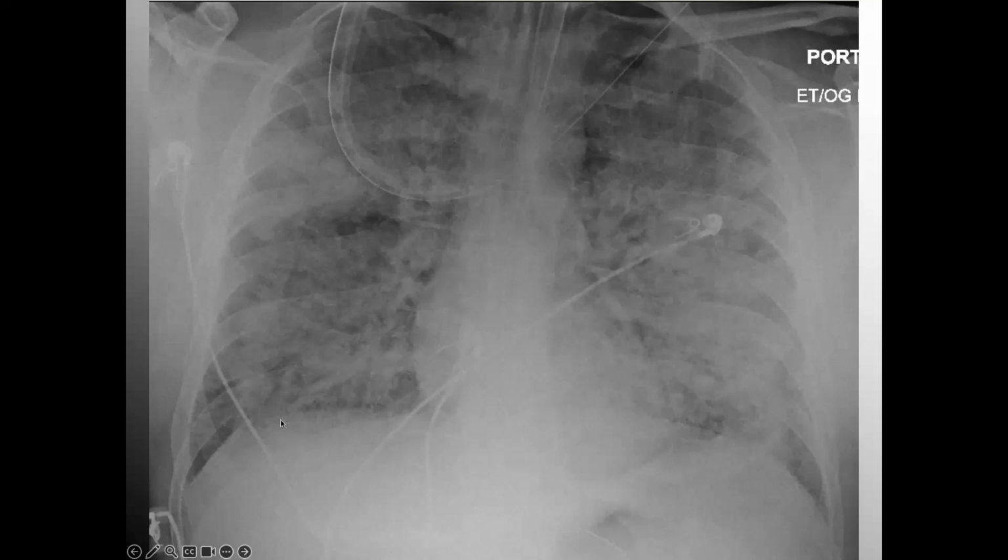We've got the D, diaphragm. I can see it's fairly delineated, but not with clarity on both sides. The right is slightly elevated above the left. The sulcus, I believe we're getting a little artifact from this anterior rib coming across. That one looks sharp. I don't suspect any effusions present, at least enough to manifest the meniscus sign.